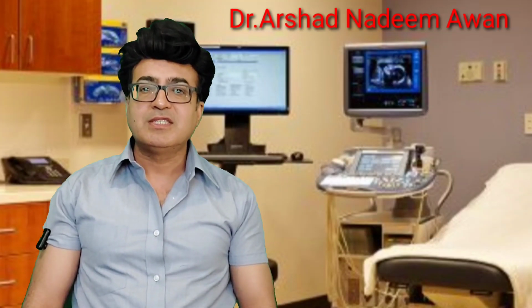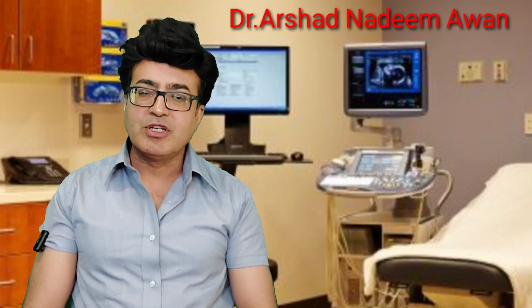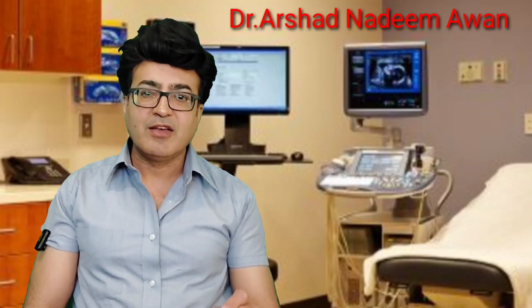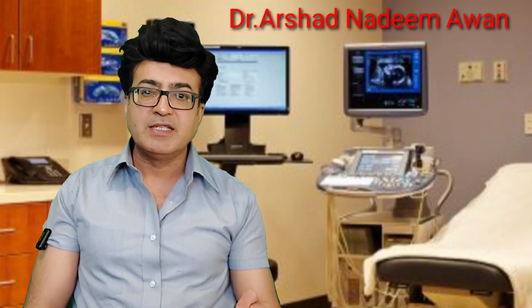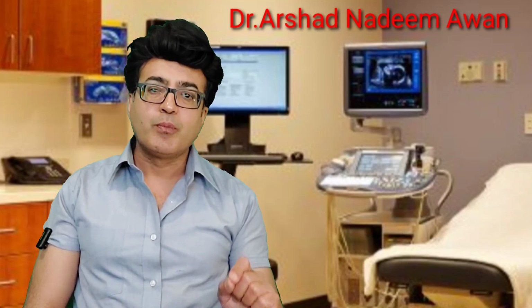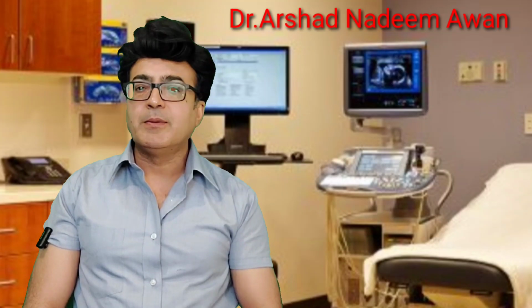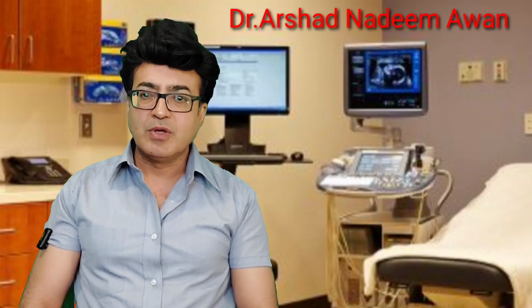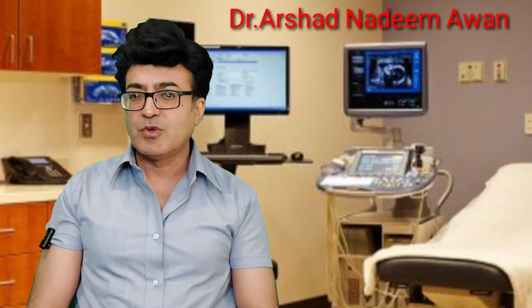So all these points have been already discussed. I'm going to show you some slides and images. On these slides I will again narrate all these findings, and it will be easy for you to pick them up on the ultrasound imaging and pin down all this information in the ultrasound report to produce a very quality report. So let's start watching these images.